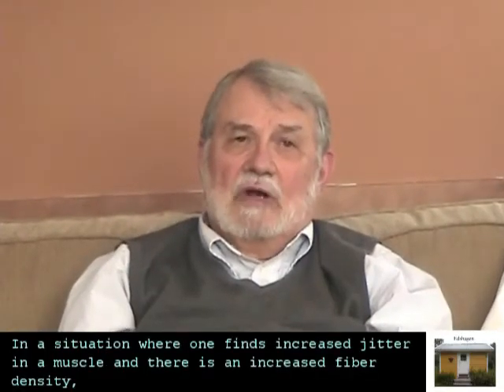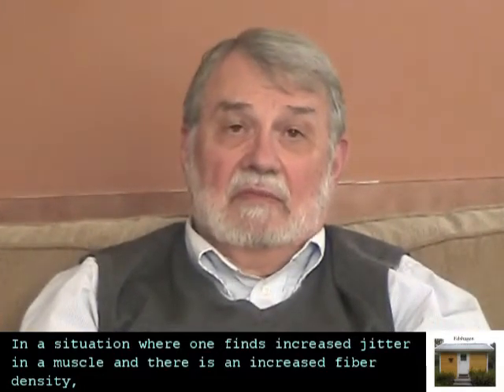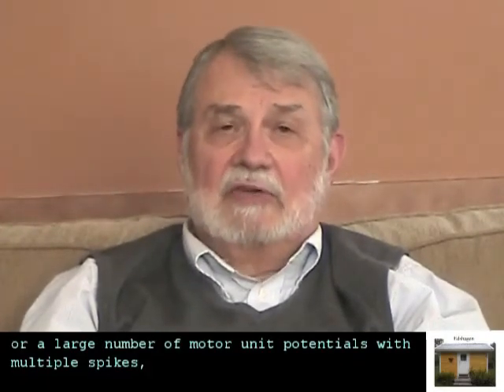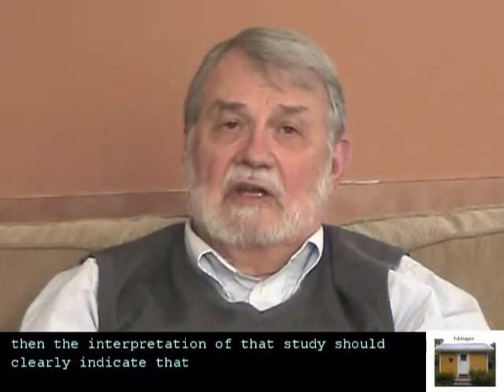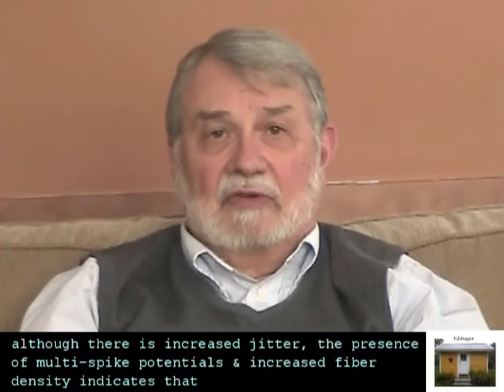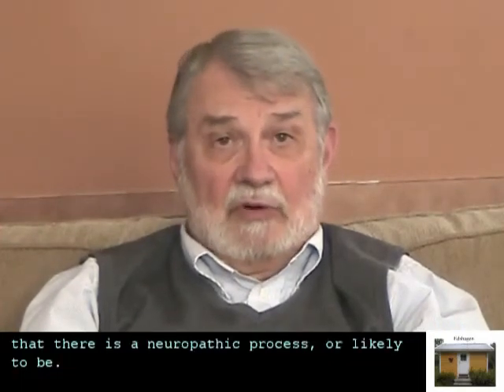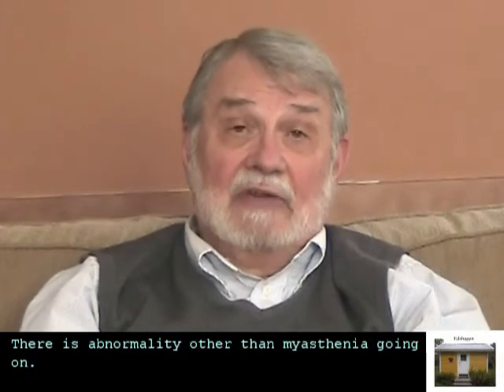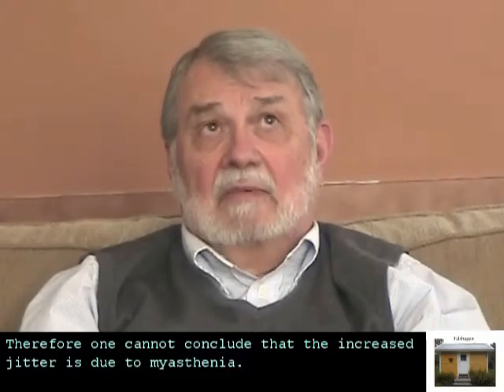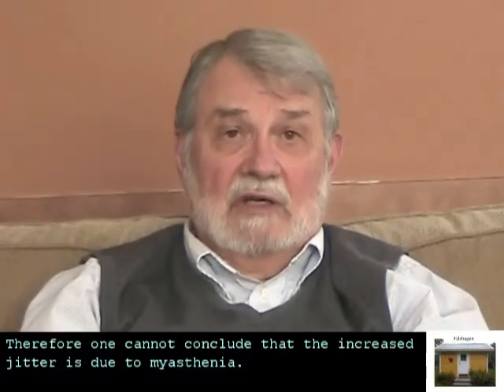In a situation where one finds increased jitter in a muscle and there is an increased fiber density or a large number of motor unit potentials with multiple spikes, then the interpretation of that study should clearly indicate that although there is increased jitter, the presence of multi-spike potentials and increased fiber density indicates that there is a neuropathic process, or likely to be. There is an abnormality other than myasthenia going on, and therefore one cannot conclude that the increased jitter is due to myasthenia.